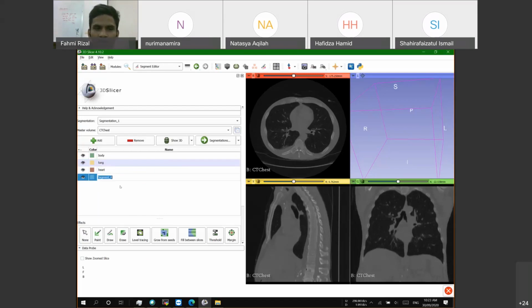You can segment all the organs, but I think it is better to just use the OAR segments specific to the case. Each case is different and has specific OARs. For the beam planning, you have to insert the GTV and the CTV.